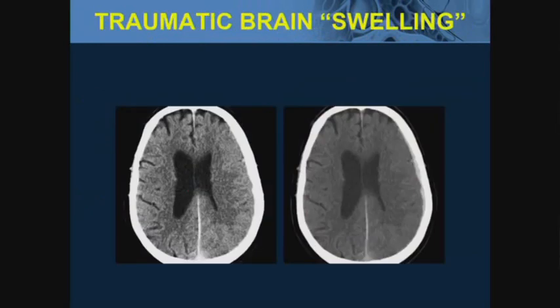Okay, let us look at this CT scan. This is an older patient who fell, was not anticoagulated, was not really doing very well. And you can look at his scan. Here is the non-con CT on the left. Let me grab the arrow here. There's a little thin subdural hematoma there.